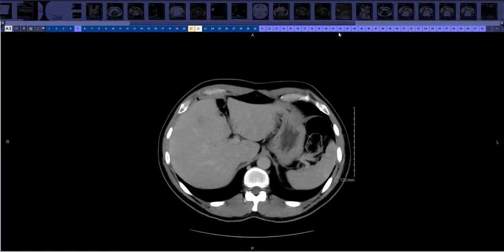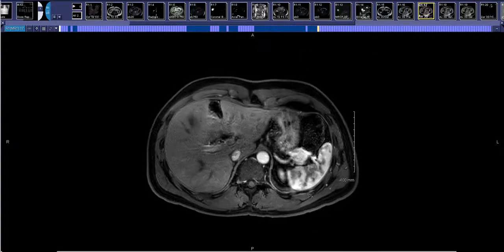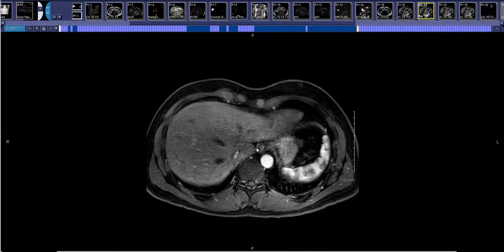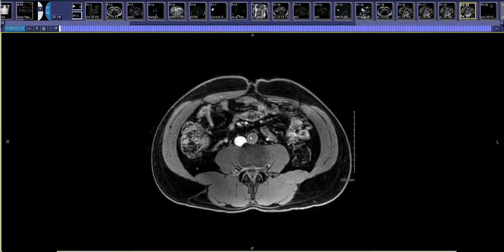You can look at the arterial and venous vasculature on the MRI also. However, MRIs tend to be prone to artifact in terms of respiratory motion, so sometimes seeing those tiny accessory left hepatic arteries can be very difficult, although I always double check on the MRI. The MRI is mostly used for the biliary system.